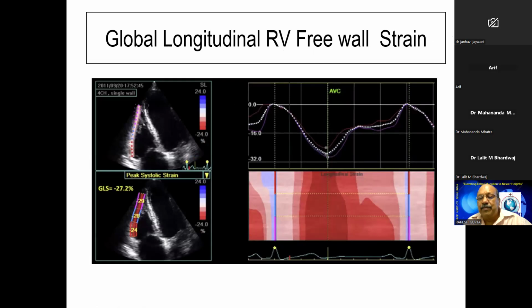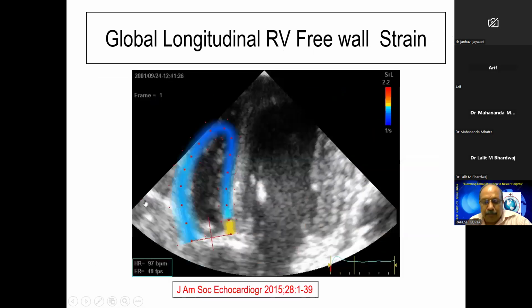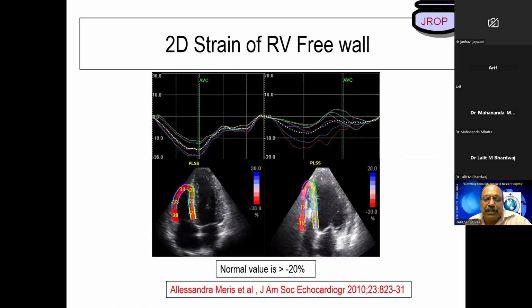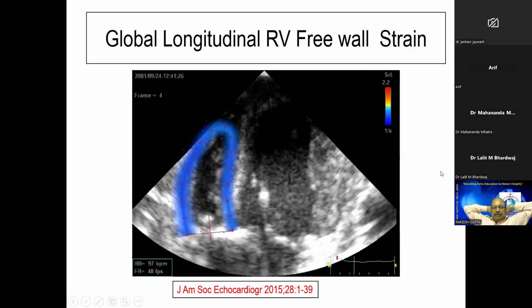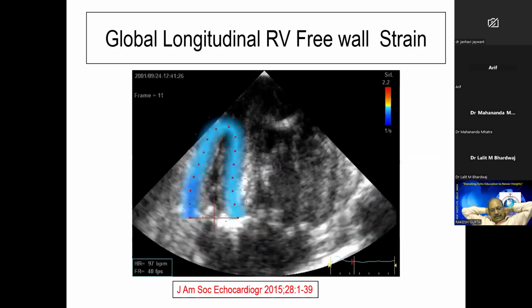In pulmonary embolism, we had a McConnell sign where the apex was spared, and mid and basal segments were reduced. Here the apex is spared, as in the previous picture. So here is minus 7, the rest is 12 and 16 or 15. This is how we look at patients who have RV systolic dysfunction.